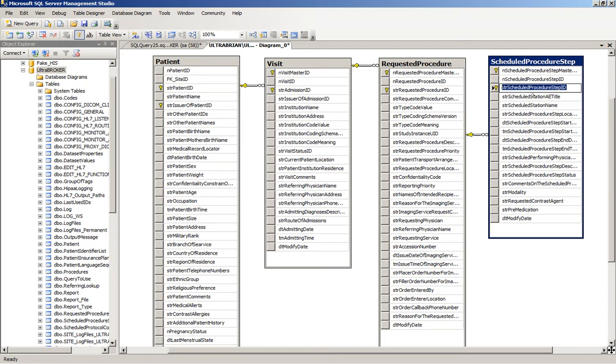And there's a whole bunch of other fields. So what I do when I look at this is I look at these other fields and I start to think about what other things that I can map from that message. So I can see patient name, patient's date of birth, the sex, and so forth and so on. So there are lots of data points that I can map into these messages.